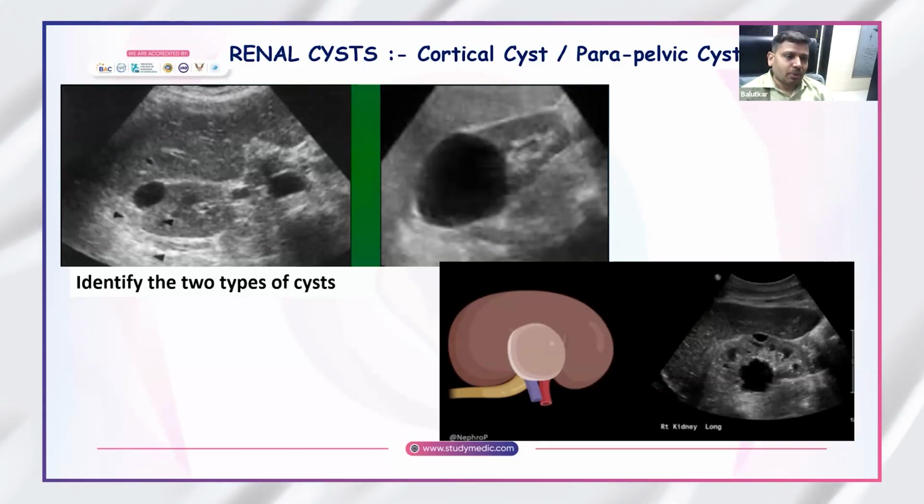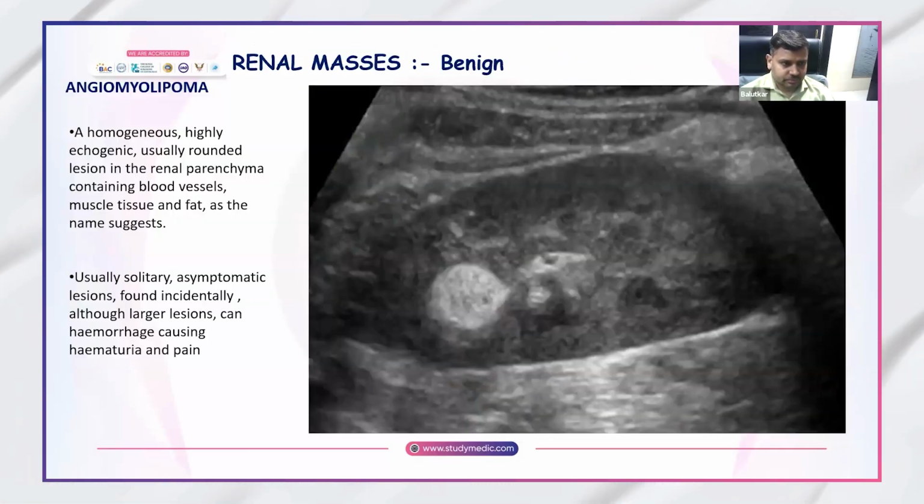But if you are seeing some solid component or thick hypoechoic walls, then you should think about other pathologies, neoplastic pathologies, a tumor with necrotic changes, instead of a simple renal cortical cyst. And that needs to be evaluated with other imaging. That's all about cystic lesions.